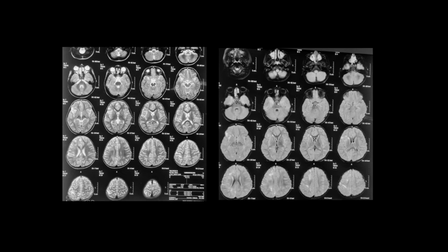So hypoperfusion can affect predominantly one hemisphere. Is that right? Hypoperfusion injury. It is quite unusual to do that, but any embolic phenomenon from the maternal fetal placental unit could do that, as well as the fact that this could still be infection, but it's unusual to again have it all on one side. Because I thought, Nihaal, you can correct me, the left side is totally normal, isn't it, on right-sided images, or do you have some there as well?